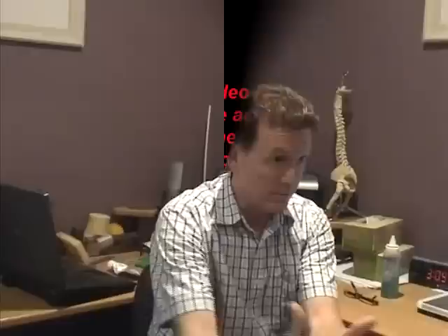So you get 2 for 1. You get a diagnostician that's really good at feet, and this gives you a bit of an indicator about the kinetic chain, and you're really good at the kinetic chain, and you're wondering whether the foot's a problem. So you get 2 practitioners assessing. I've cut you off there. You are good at feet, but it's going to take you half an hour to assess the foot. You don't want to do that, do you? So you want to get as much information as you can that's quantifiable and objective in the minimum amount of time that's going to lead you down the appropriate path.